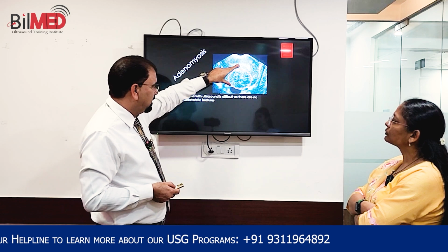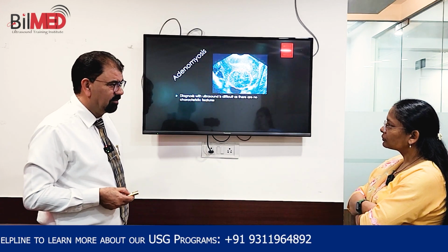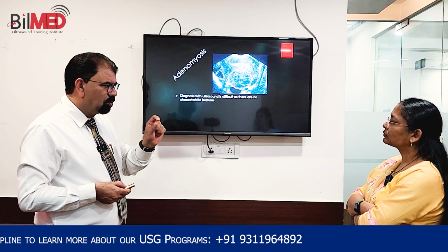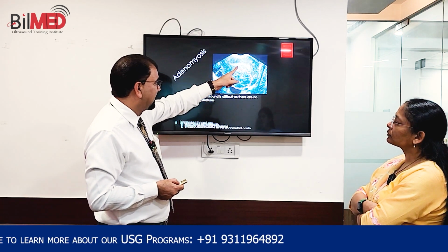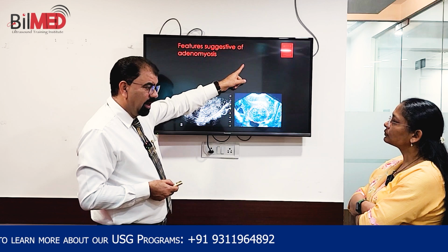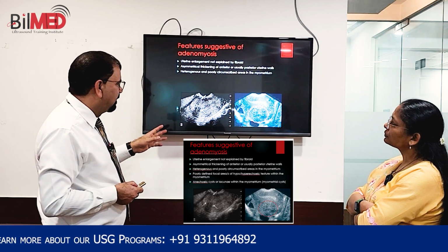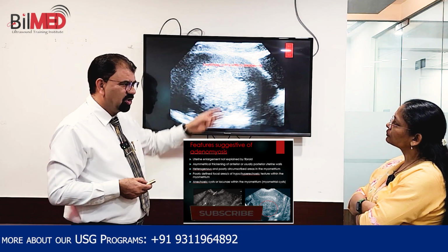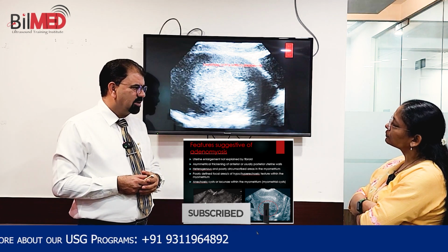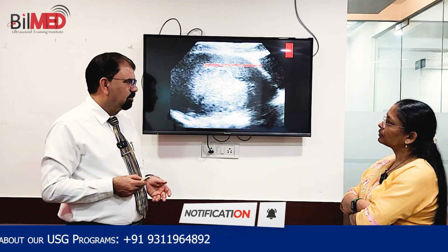So if the posterior wall of the uterus is looking thicker than the anterior, that is also going in favor of adenomyosis. And usually these small microscopic patches, multiple patches, are at the interface of the endo-myo junction. So that way I will be having a loss of the endo-myo junction. So these are some quick pointers for the diagnosis of adenomyosis.